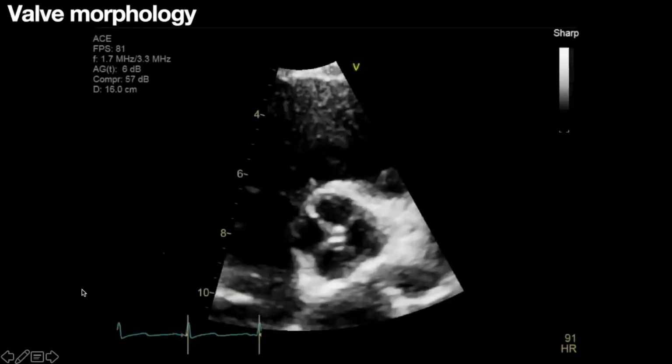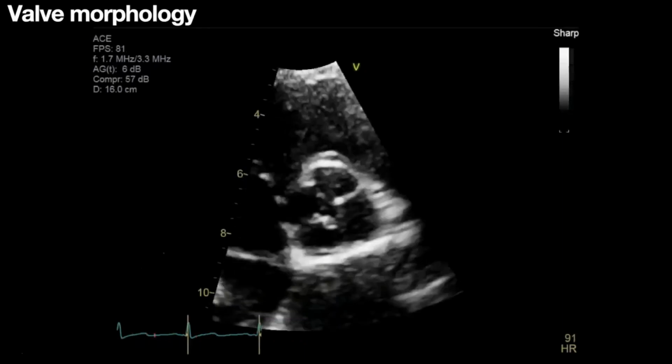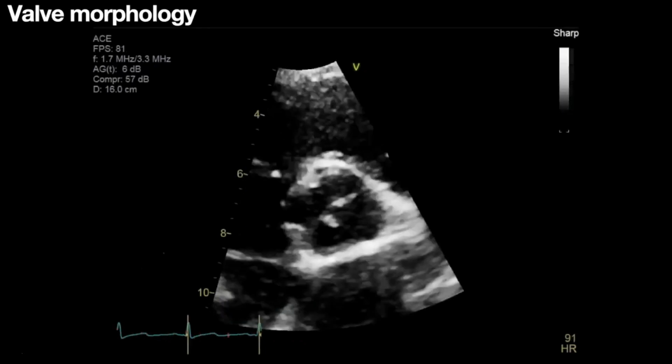All right. And this is your lucky charm, Foti. This is the last one, I promise. This is the lucky charm. This is the quadricuspid, yeah.